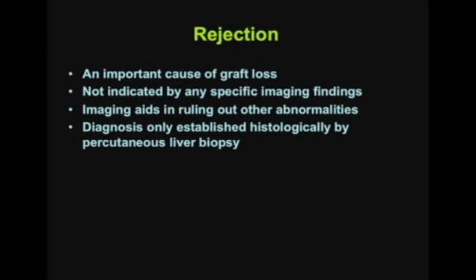Rejection is an important cause of graft loss. There are no specific imaging findings associated with rejection, but as with the kidney, imaging does aid in ruling out other abnormalities, and the diagnosis is only established histologically by percutaneous liver biopsy.